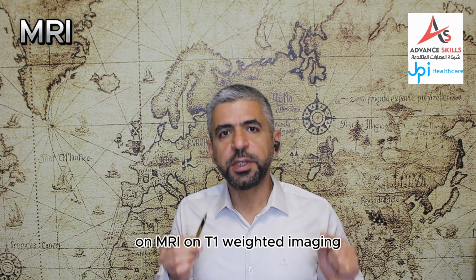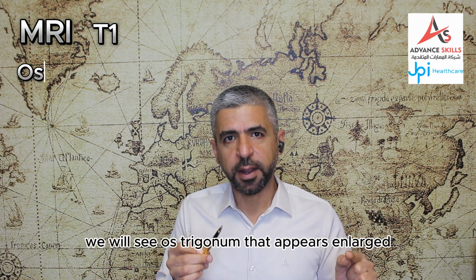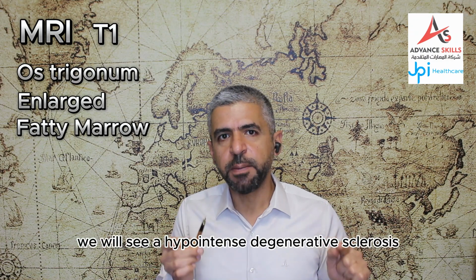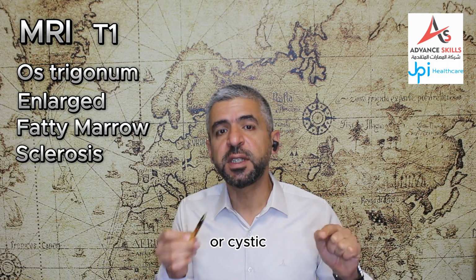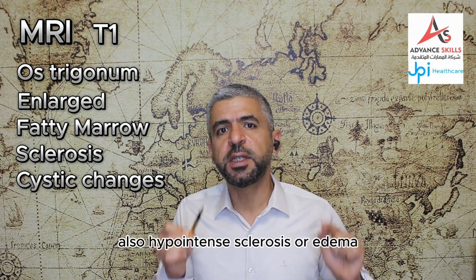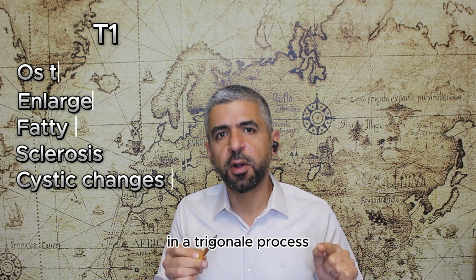On MRI, on T1 weighted imaging, we will see os trigonum that appears enlarged, containing fatty marrow. Also, we will see a hypointense degenerative sclerosis or cystic changes between the os trigonum and the talus. Also, hypointense sclerosis or edema in the trigonal process.